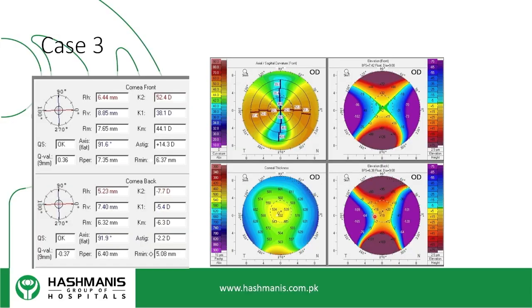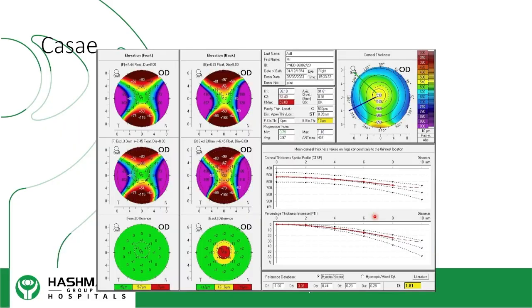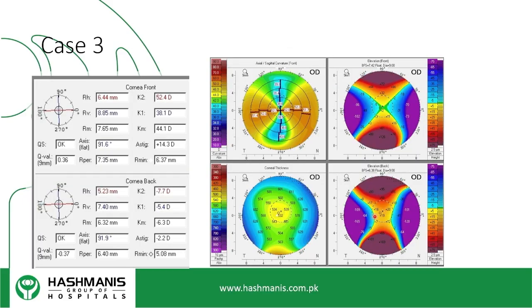Then this case that I keep talking about, you've seen the butterfly shape. You see this person has a very high astigmatism. He's got a butterfly shaped cornea. He's got some pachymetry issues, and the elevation that's coming back is actually just astigmatism based. So what is this case? You're getting posterior elevations and all of that stuff. Now, what is this case? This case, you should be thinking about large angle kappa, you should be thinking about keratoconus, you should be thinking about pellucid marginal degeneration. So once you go to the Scheimpflug image, this is why it's very important.